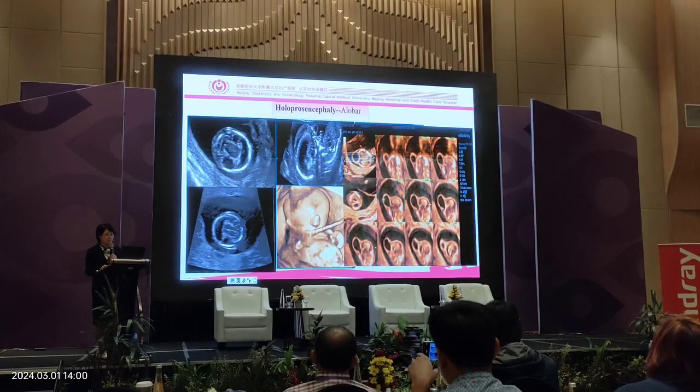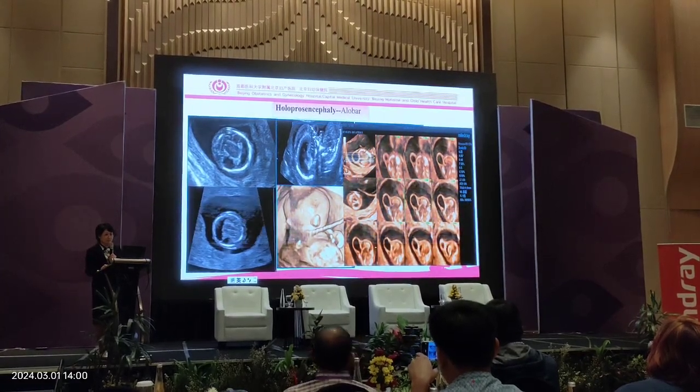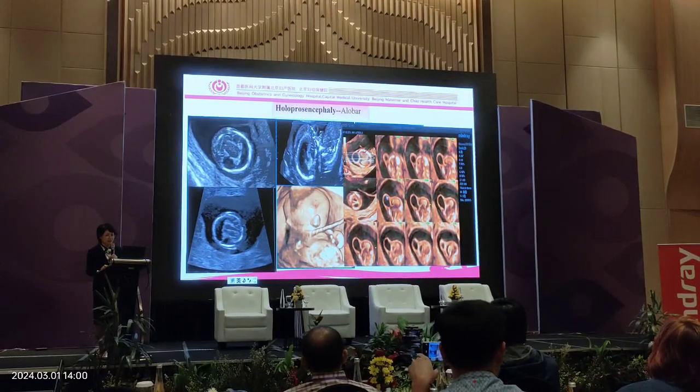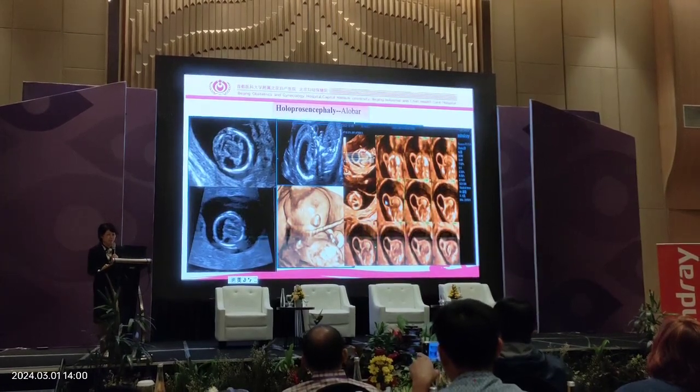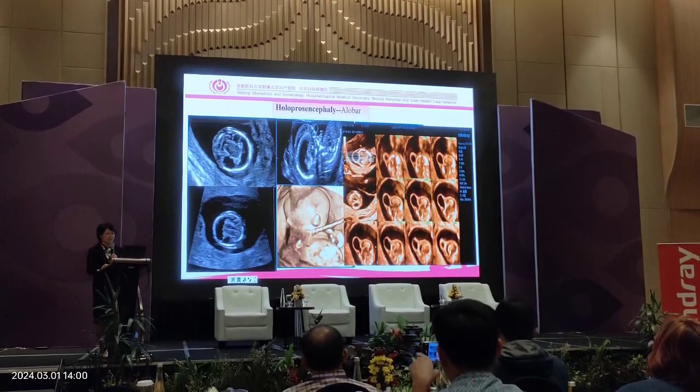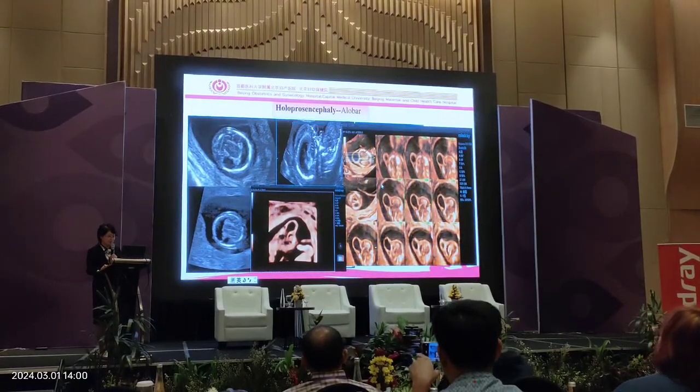Is it the same or not? We can see the break of the head scalp and the brain, with tissue protrusion. So it's different. Like this, different.